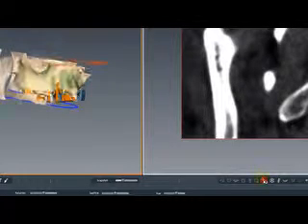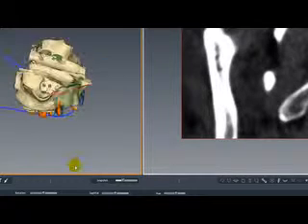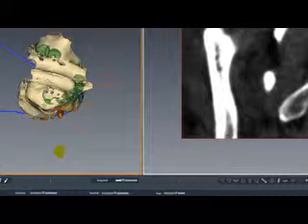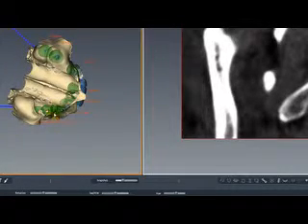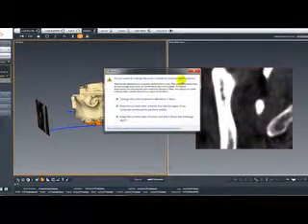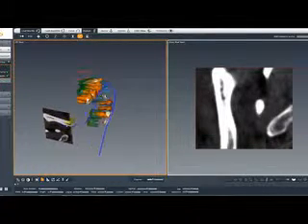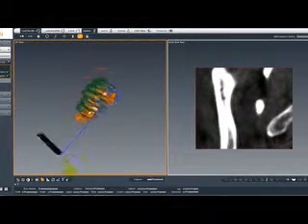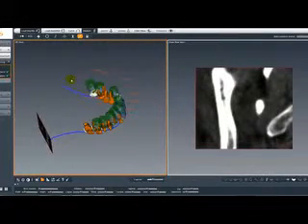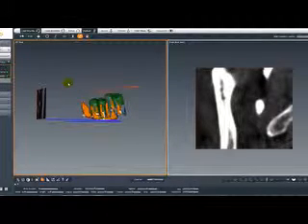If I place the bone back in there again and remove the volume view and flip this view right here, you will notice that there's definitely going to be a nice sinus graft that will be necessary to get this case to work. So let me just go back to the same thing, remove the volume, and I will start by placing the cross slicer view on some of these areas that we are talking about, starting with tooth number 3 on the right side.